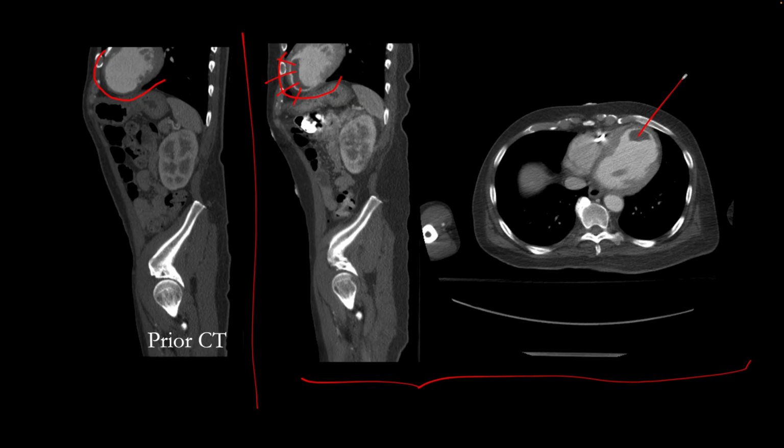This is a thrombus. A thrombus is common in patients who have had prior MI, as a result of which the left ventricle is dilated and aneurysmal, and recognition of this thrombus is very important because this can lead to emboli and lead to stroke in these patients.